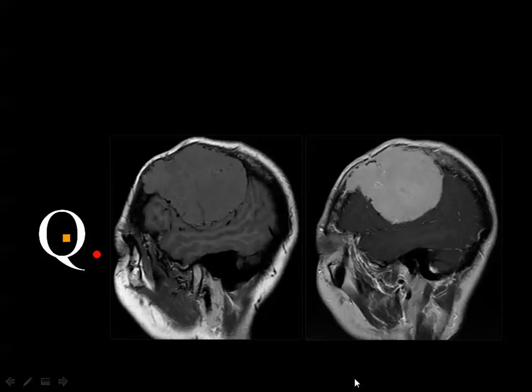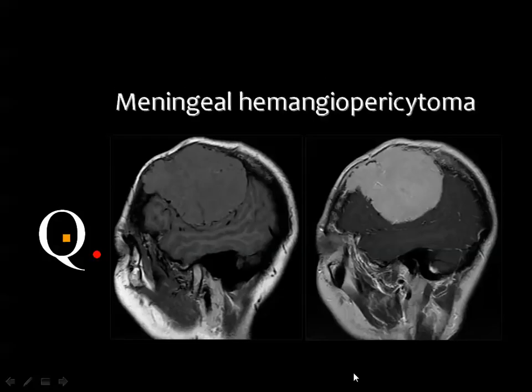Meningioma. I said that aggressive meningioma is not usually used in this category, but you may say that this is hemangiopericytoma, which is one of the tumors arising from the meninges with aggressive characters, and it is commonly seen in males of relatively older age. Yes, you can see the CSF cleft sign because this is an extra-axial pathology.